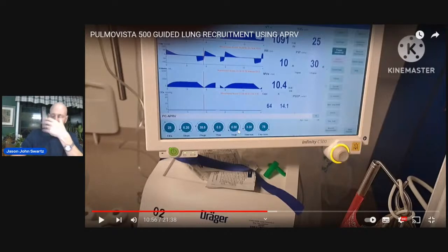And that brief release is set based on the clinician, always based on the end expiratory, the peak expiratory flow. So as your compliance changes, you'll see that the curve of your end expiratory flow goes like this, and then as compliance gets worse, it goes like that. So as your compliance worsens, your T low will go down, meaning you'll have a shorter and shorter T low, briefer and briefer. As your compliance improves, usually your T low increases.